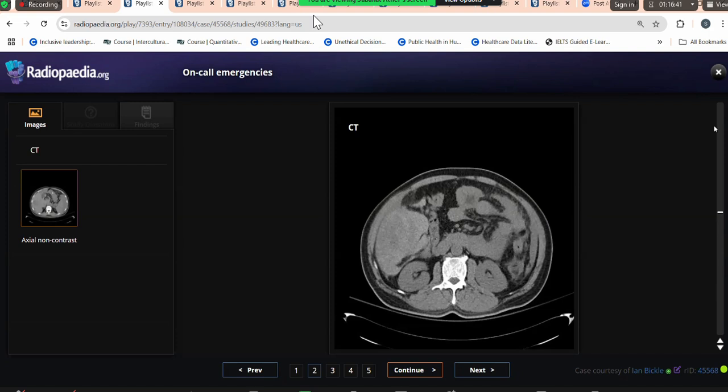And on contrast enhanced CT, I would like to further see the signs of the shock that includes the flattened inferior vena cava, enhancing adrenals, and the shock bowel syndrome. And emergently, I would pick up the phone and alert the referring physician of the findings and refer this patient to the surgical team urgently for further management, as this is a case of shock and it requires urgent management.